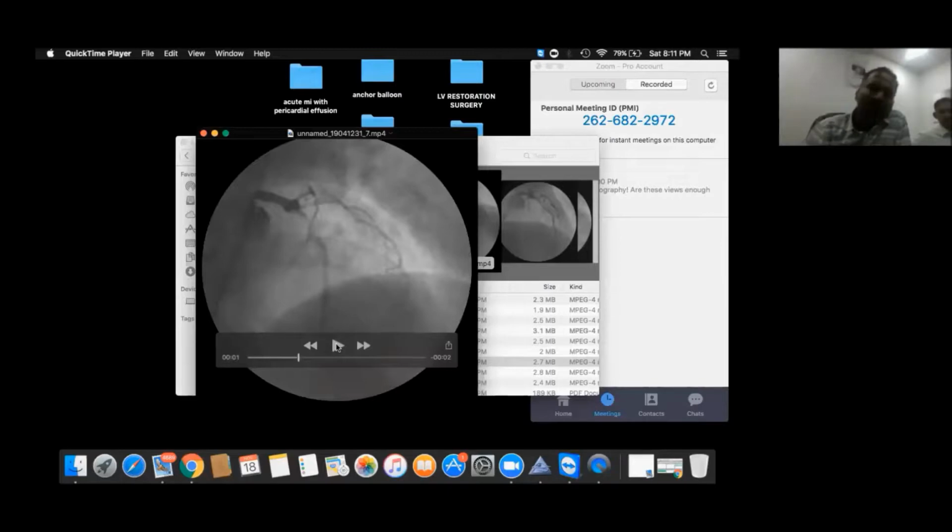In one view, the diameter is less than 1, sorry, in the other view, my maximum diameter is around 4. So this is a very eccentric lesion, and this quite commonly happens at ostial LMCA. Ostial LMCA is one area where many times people miss lesions.